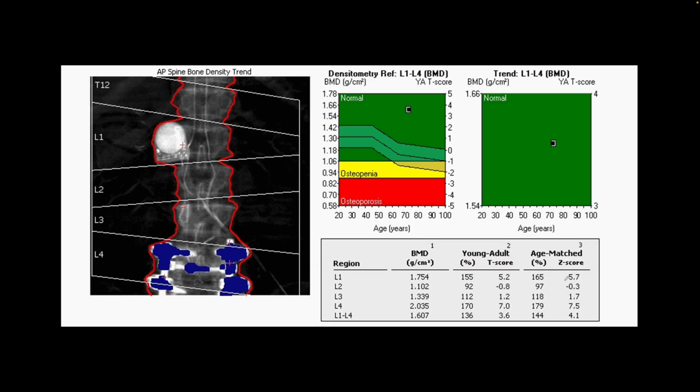This is our last patient, and this is interesting because they have several artifacts on the single image of their DXA scan from the spine. The technologists have labeled the vertebral bodies, and right next to L1 we see a device, so we cannot use this for analysis.